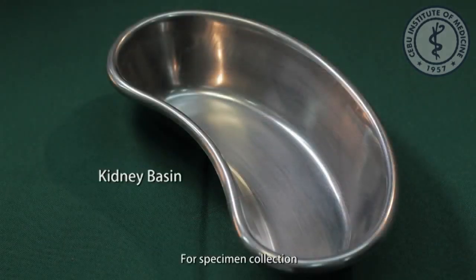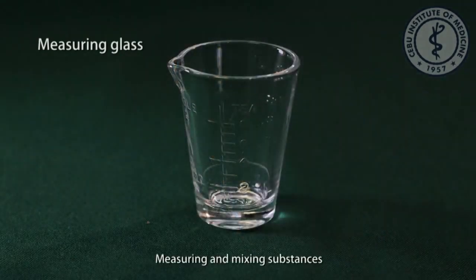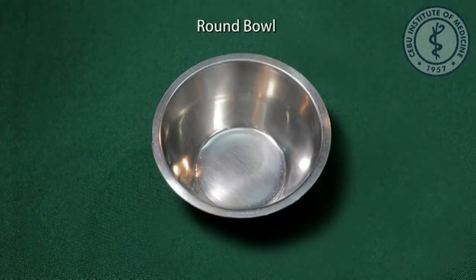Kidney basin, for specimen collection. Measuring glass, measuring and mixing substances. Round bowl, also used for specimen collection.